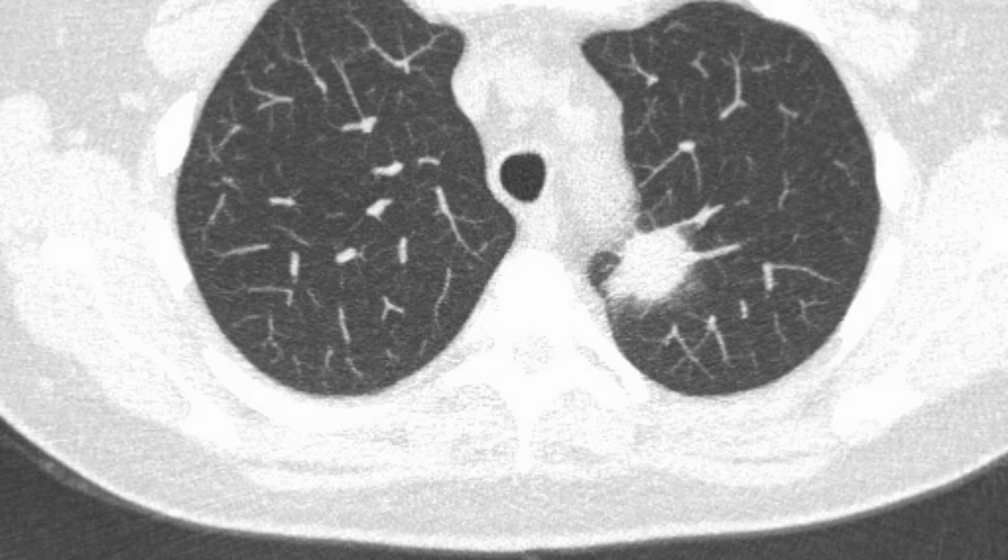Hi everybody, here is our 5th radiology know-how case. Please specify the lesion present.